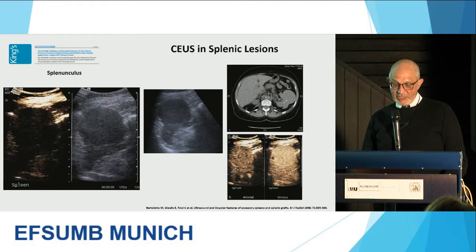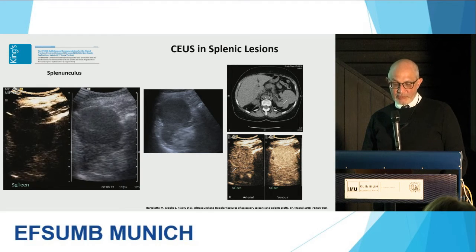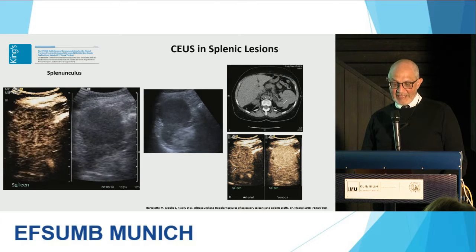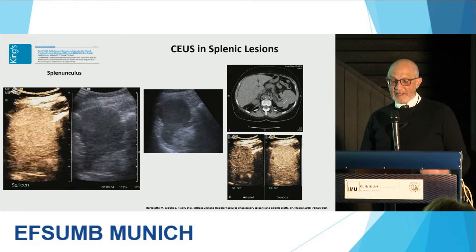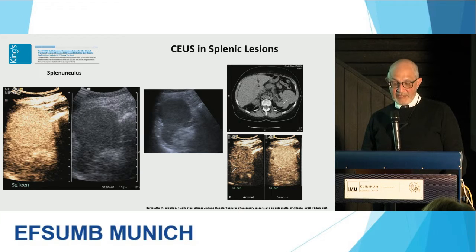Here we have a very large lesion on CT for renal colic, so there's no enhancement there. Just watch that large lesion enhancing with your contrast-enhanced ultrasound. And look carefully at the zebra pattern again, appearing in that splenunculus, and it looks like it would in the early phases of your CT or contrast, and there's a tiny cyst in it as well.